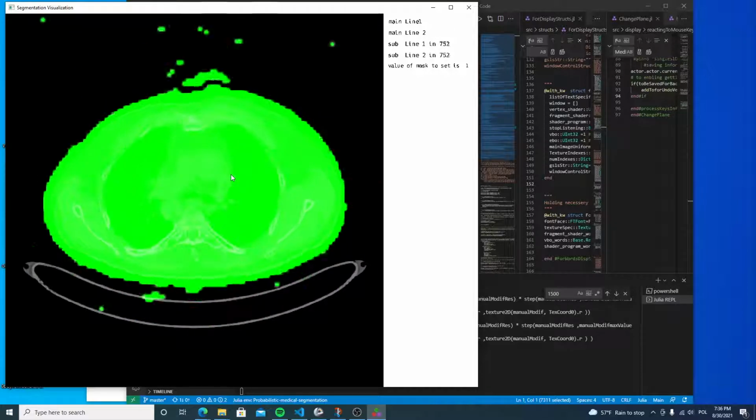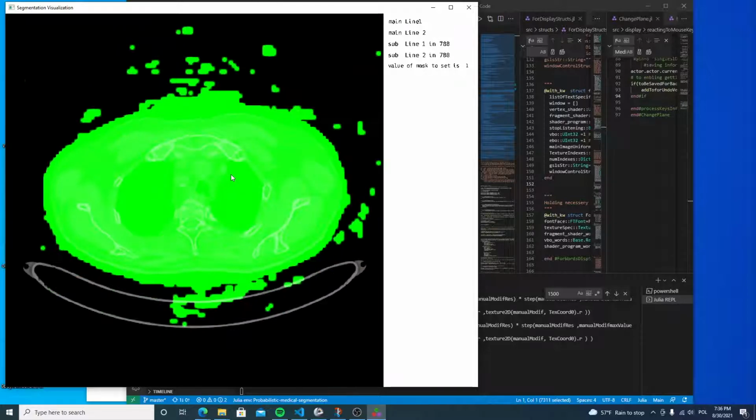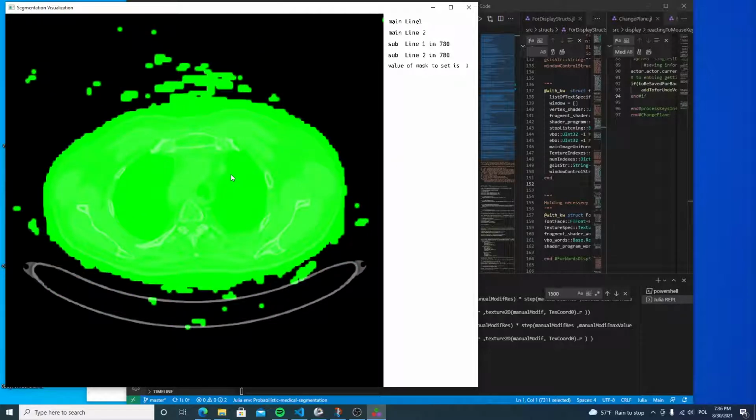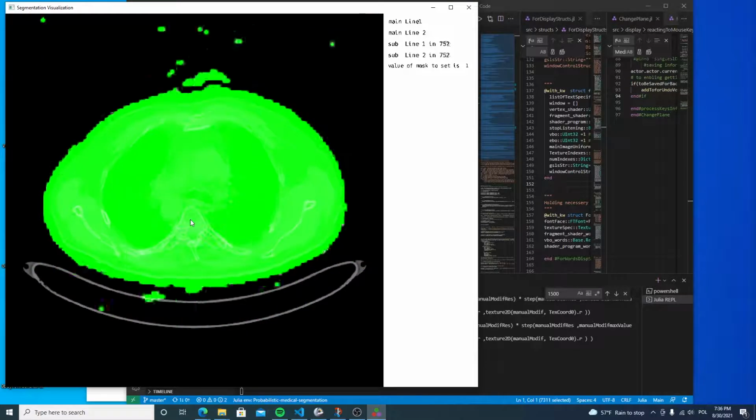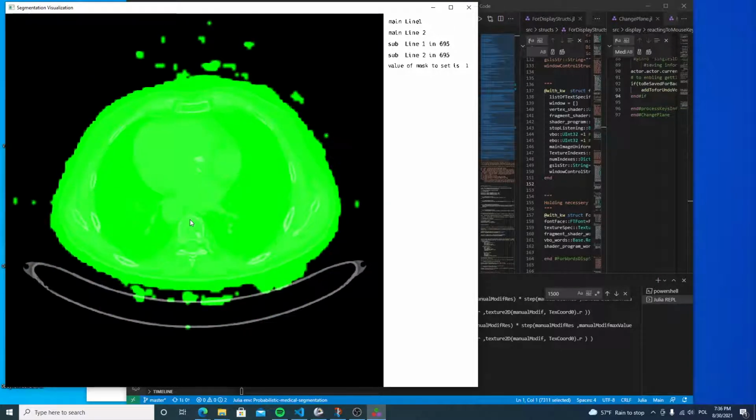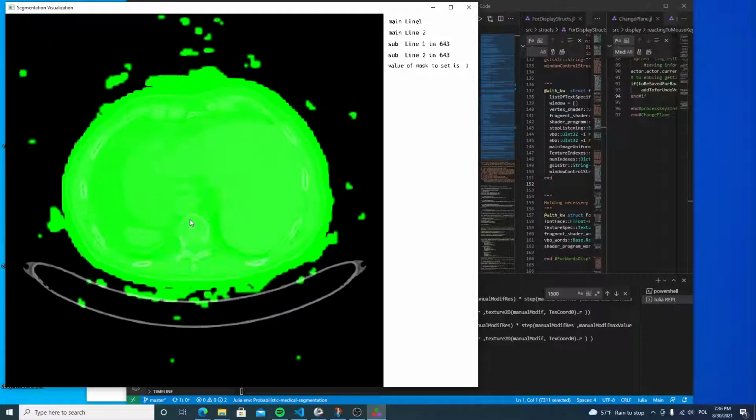The more interesting example was on different datasets and is presented in the article associated with the package. Yet the most important idea is that we can subtract two masks and see where one mask is present and has higher values, and where the other mask has lower values. Okay, thank you very much.